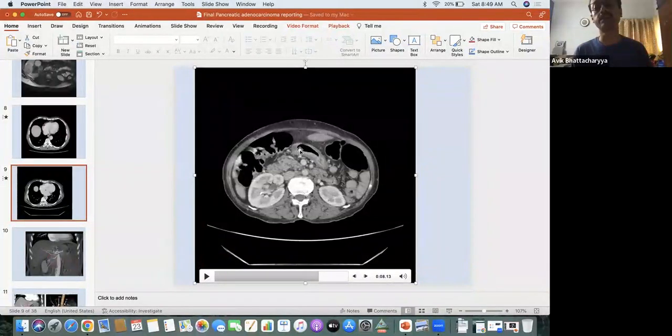This is the stomach, and this is the duodenum. This is the colon, this is the right kidney, this is the left kidney. This is the whole anatomy. Here all peripancreatic and retropancreatic lymph nodes would be seen, along the superior mesenteric vessels. This is pre-aortic, this is para-aortic, this is aortocaval, this is precaval, this is the celiac trunk and perisuperior mesenteric vessels.